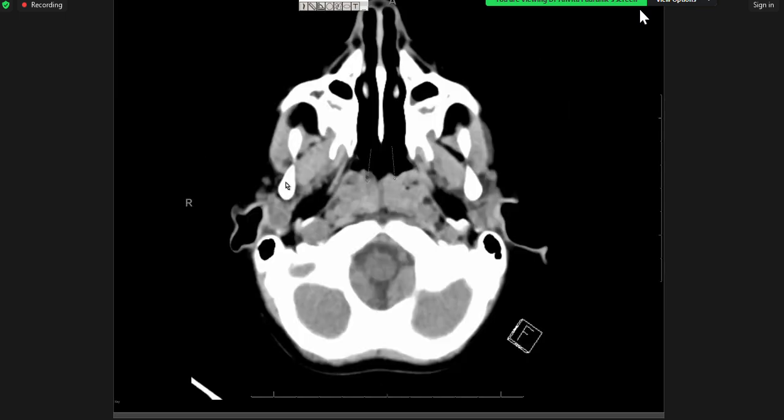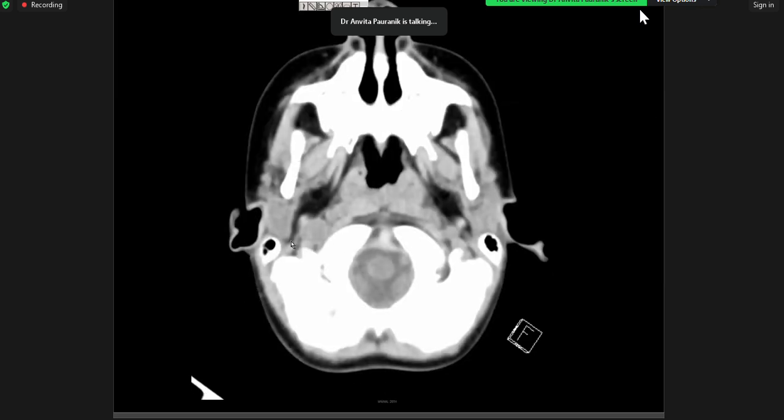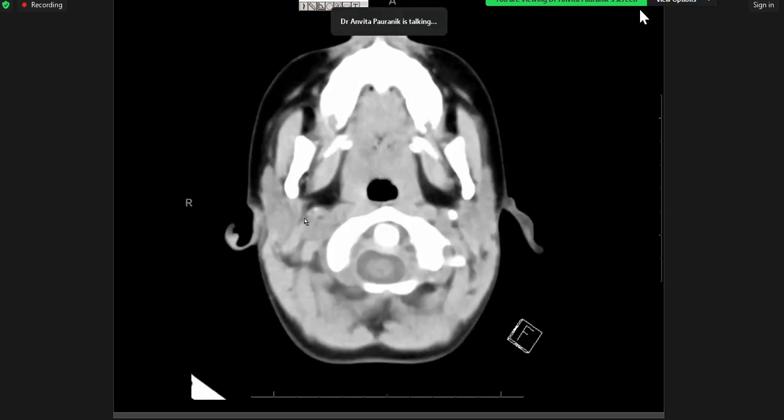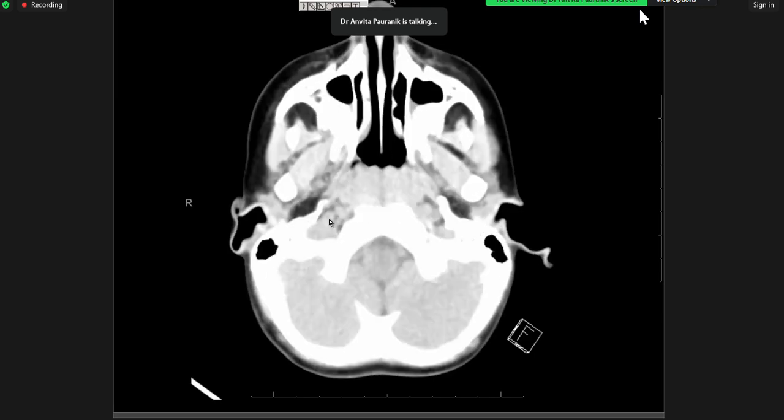What else is happening at the skull base? So we are just windowing. Sometimes, in cases of acute trauma or stroke, one of my checklist items is to look at this structure here. What is this at the skull base? Do you know this fat, the triangle of fat? Lower down, especially here, the parapharyngeal fat, okay? And what is this round structure here? Yes, the ICA, the internal carotid artery as it enters the skull base.